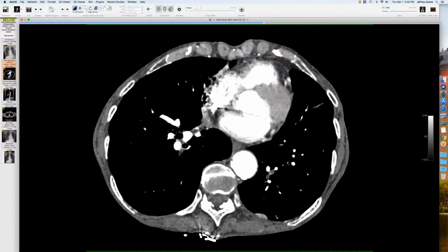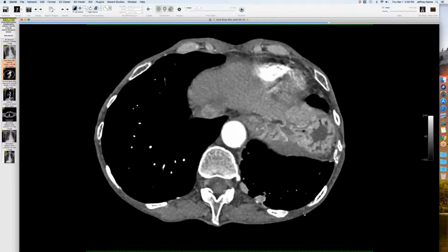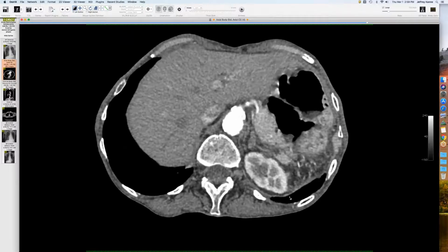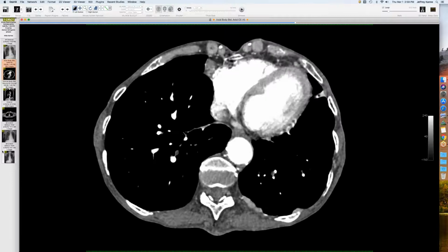They may be enhancing along the pleural surface here, and it's very unilateral. And if you haven't figured out where I'm going with this yet, you'll notice there's some old rib fractures down here, and then we get into the belly, and Mr. Spleen is not there, so this is just a nice example of splenosis, pleural splenosis, and that was confirmed eventually on an old abdominal CT that showed the same findings.